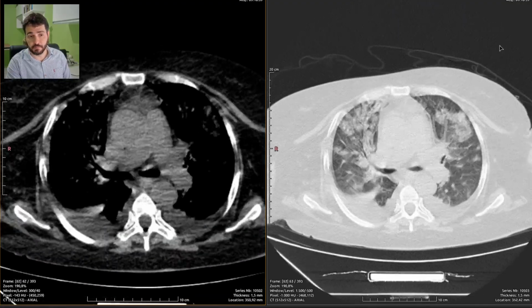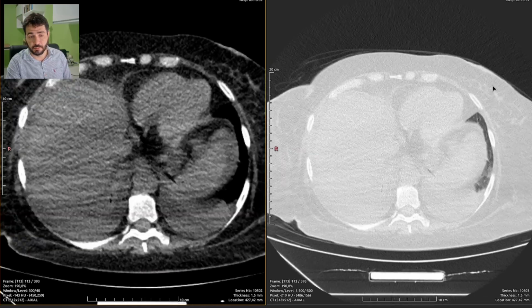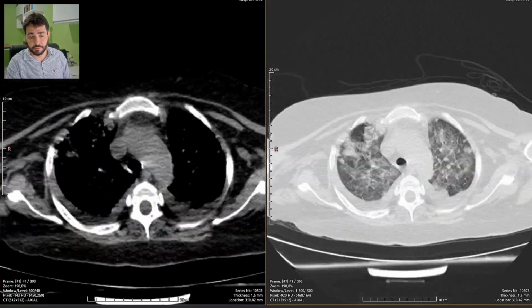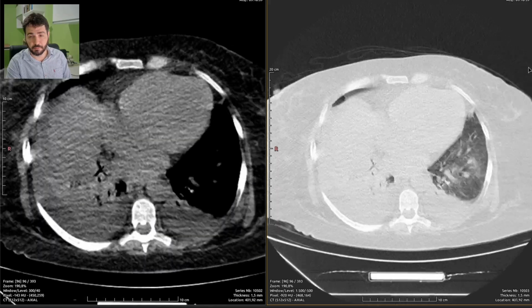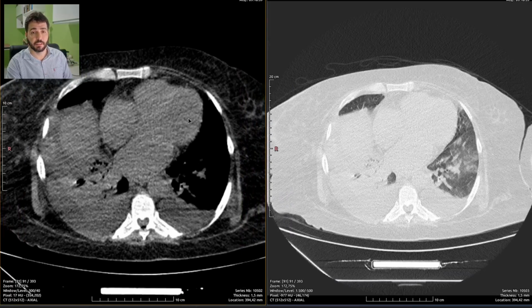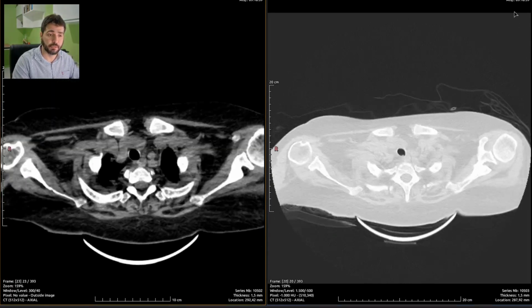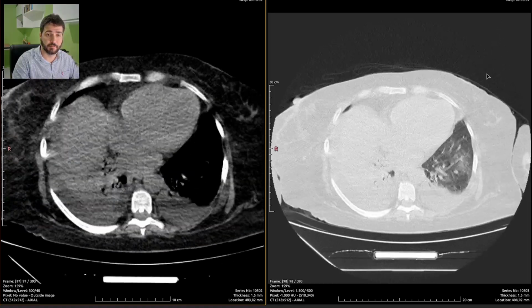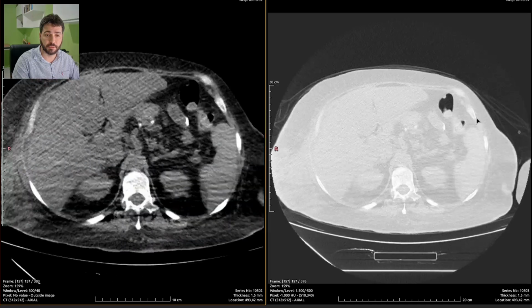I've got to work on my pronunciation of those phonetics. I can't really tell if there are. This is so shaky and badly done that I can't really tell if there are enlarged lymph nodes or not, and so there should be very important enlarged lymph nodes.